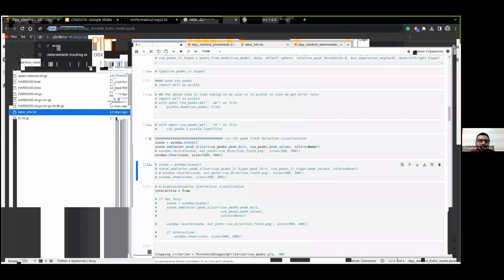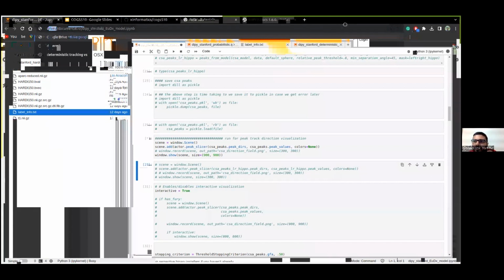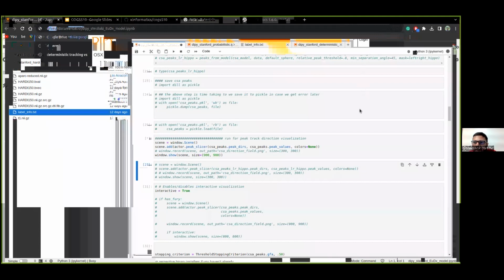So let me change to that. How do I change it? I'm just trying to figure out how to change.